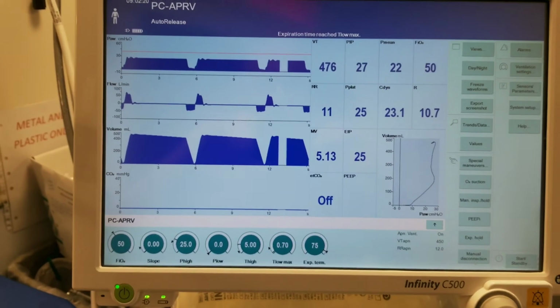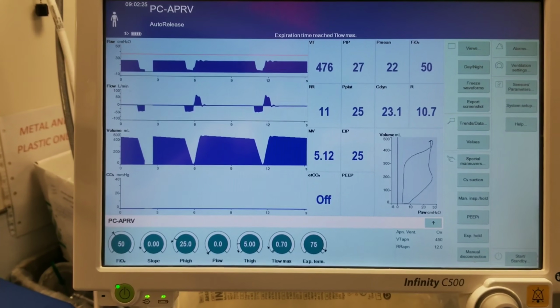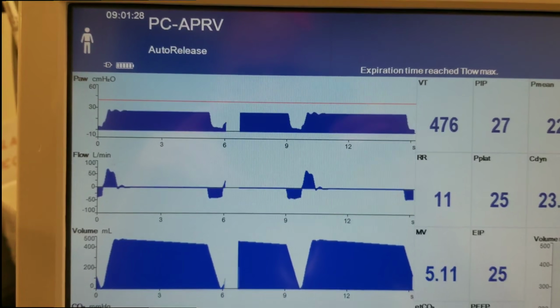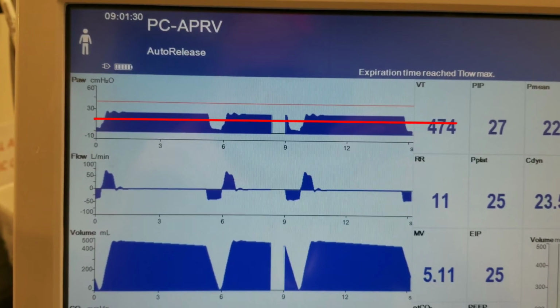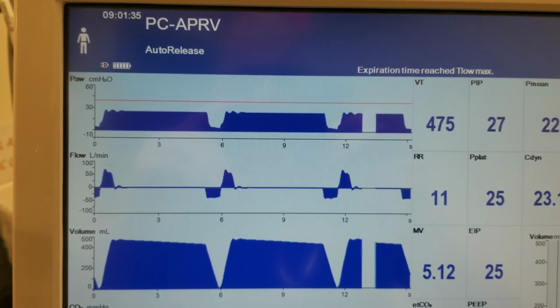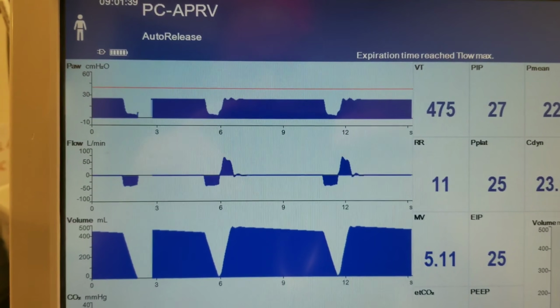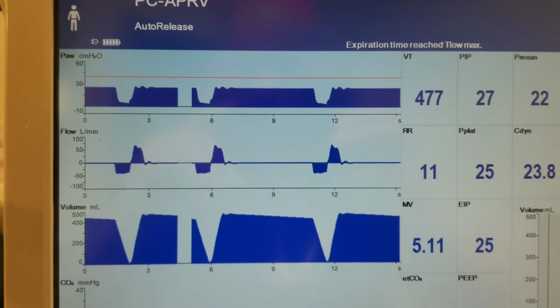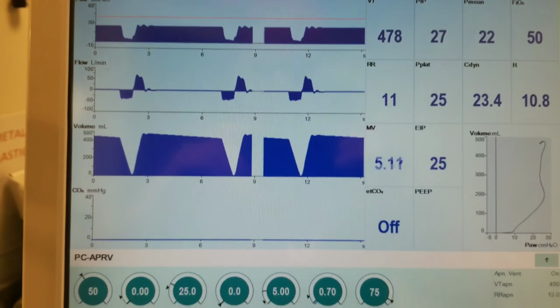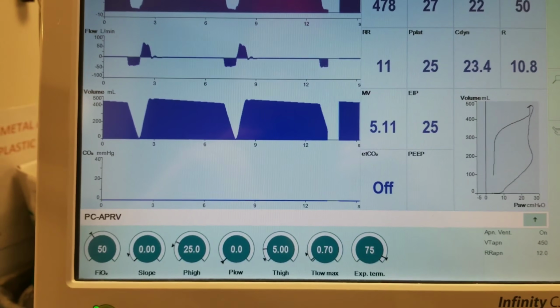Keeping in mind that I don't want to give the impression that CO2 is evacuated only during these release phases. Don't forget that this patient could be breathing spontaneously through all the cycles, and that this will also create expiration of CO2. But the airway pressure releases really help take a large bulk of the CO2 out through the process of convection after the P high has used diffusion.